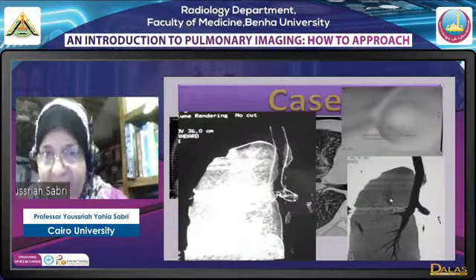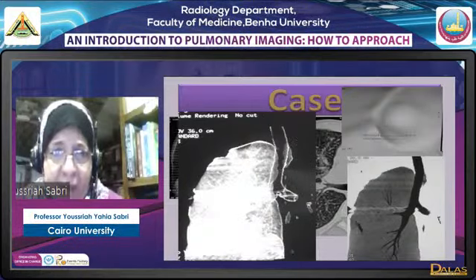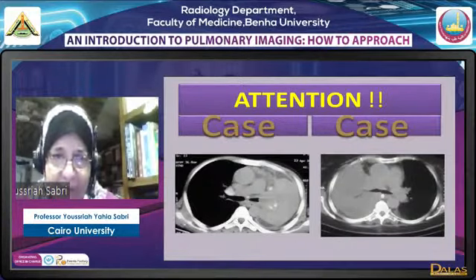You see whatever is black here. So you see the bronchial tree with total obstruction of the left main bronchus, and on the left side here, you have the 3D image, volume rendering. Now, pay attention to these two lesions. We have seen those two cases.